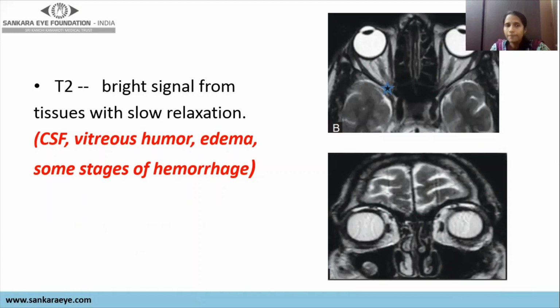So during this time, when the energy is recorded, you will find that the vitreous, CSF, edema will appear bright because it has higher protons. It is taking a long time for it to relax back to its resting state. So this will produce a bright signal.